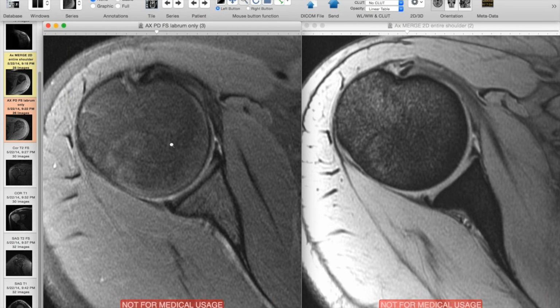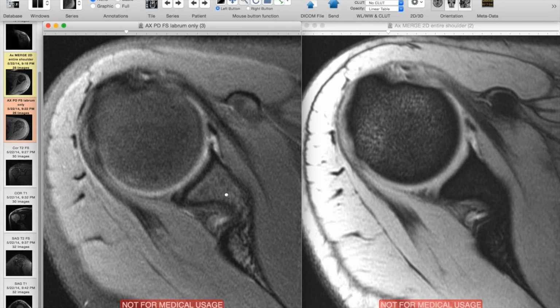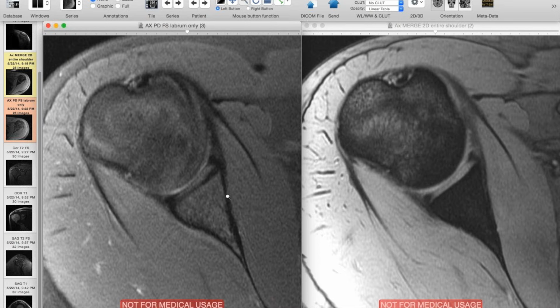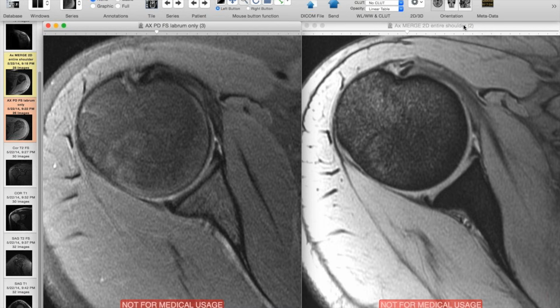Shoulder articular cartilage is perhaps a little less important or less damaged in athletes than in the knee or hip, for example, but it's good to look at the cartilage. And so the cartilage here is this gray structure here and this gray tissue along the humeral head there. You want to look for homogeneity, look for focal defects, and so on. So those are the main things that I look at on axial MRI of the shoulder.